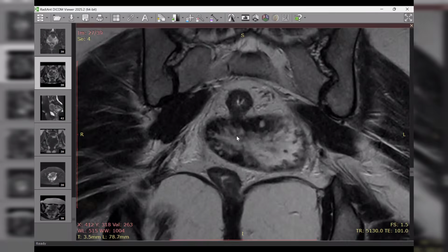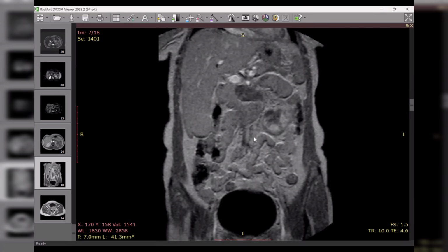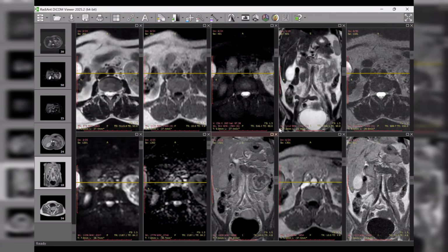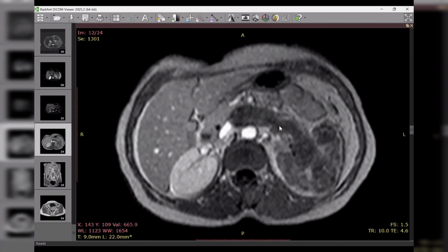Going from up to down, kidneys, to the vein thrombosis, it was not lymphoma. While we were discussing this case, I told our candidate, if this is a malignant thrombus, we have a rule, it will enhance, and the lumen of this vein will enhance. You got my point? So you should carefully delineate the thrombus itself. If it is enhancing, 100% I will go for malignancy first. But if it does not enhance, I will come back again, then I will check. This could be isolated left renal vein thrombosis.